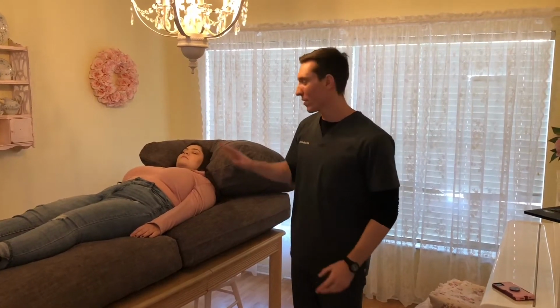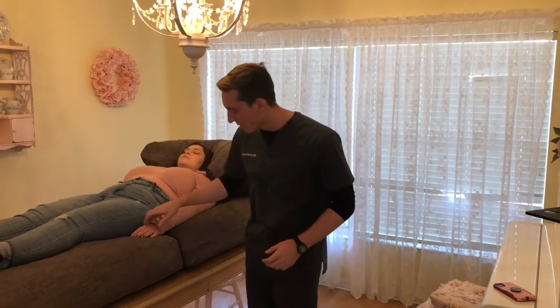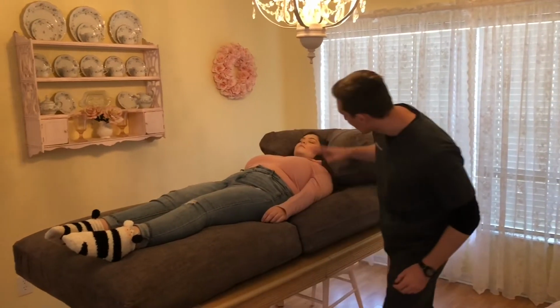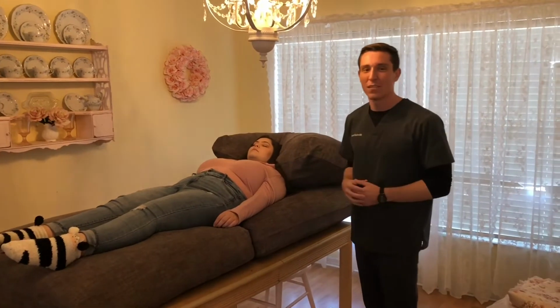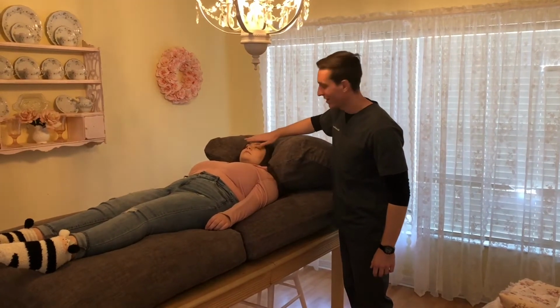Now, in these patients who are unconscious in the ICU, there's a procedure that the reading neurologist requires that the technologist do, and it's called activations. All that is, the technologist will come and stimulate all 4 of the patient's limbs, and also, if they're unconscious, let's say they're on a ventilator, they will passively open the eyes of the patient.